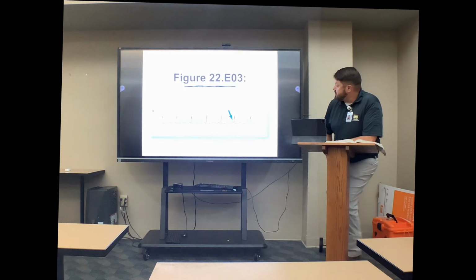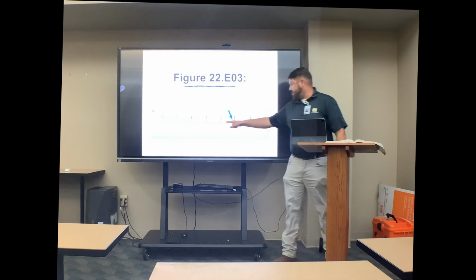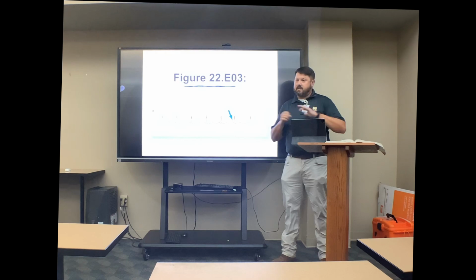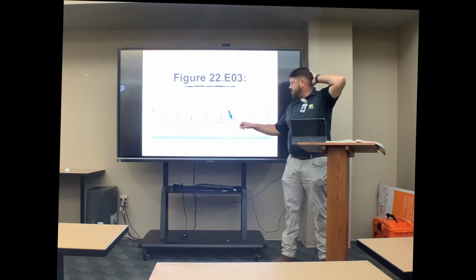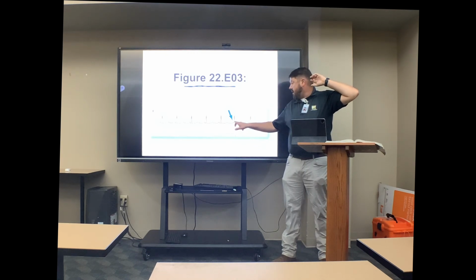So what are you seeing right here? You're actually seeing this kind of merged into that. You've got a whole bunch happening, but PJCs actually cause ventricular conduction. This P wave right here is not causing it, because that P wave would be hitting the ventricles during the refractory period. Does that make sense?